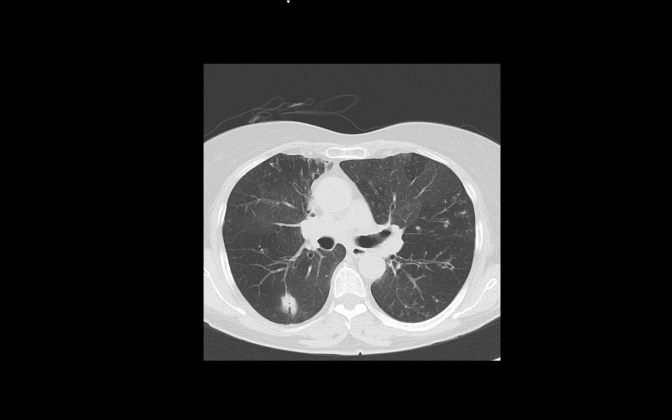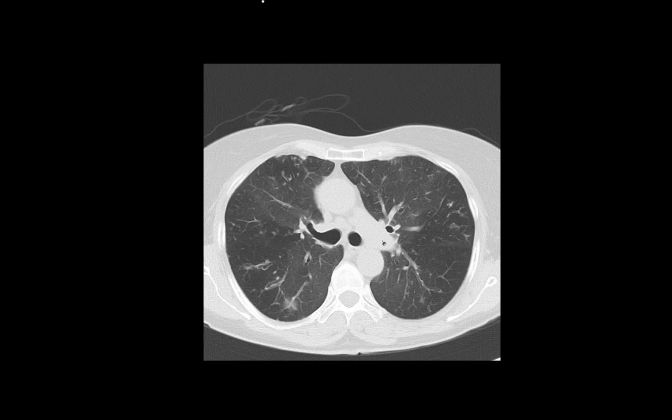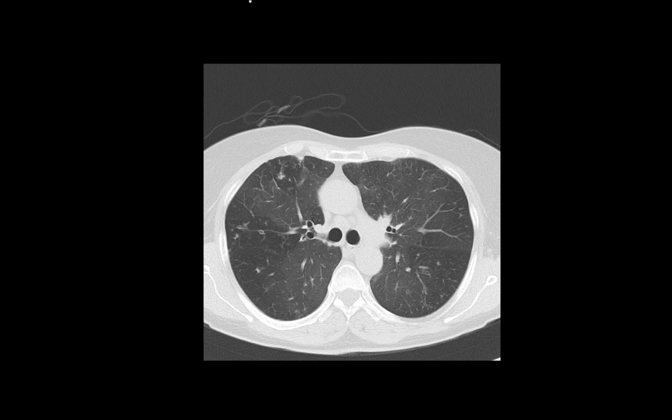And you know, you can sort of say that, well, that's where the airflow is going to carry it, because it's usually a straight shot from this right upper lobe bronchus, just sort of pointing the organisms in this direction when you inhale. Okay, so this was a case of bad MAC with a big abscess cavity in the right lower lobe, and it's better on intensified therapy for her MAC.